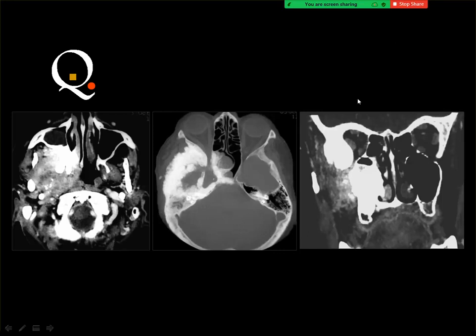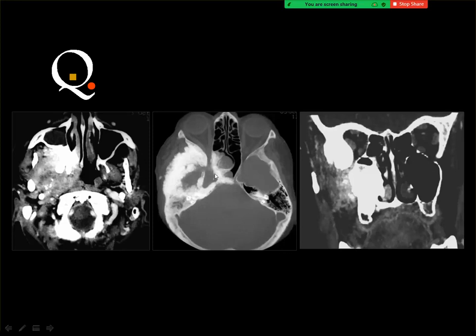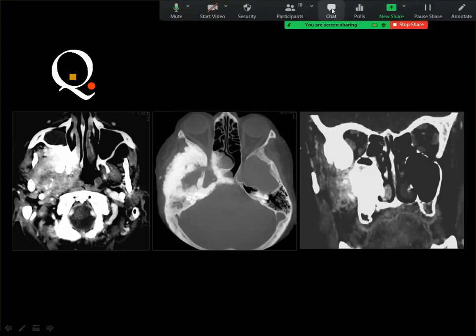This patient has what looks like an extensively sclerotic lesion affecting the greater wing of the sphenoid and also some of the lateral wall of the ethmoidal air cells, and the pterygoid plates are associated with this mass. Actually, I know that this is a difficult case, but you may collect these facts to reach a diagnosis.